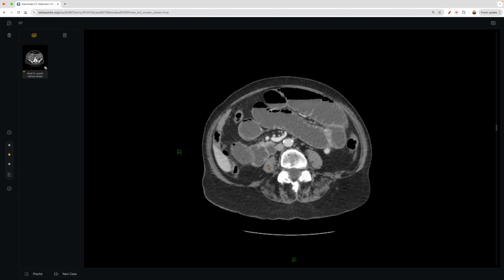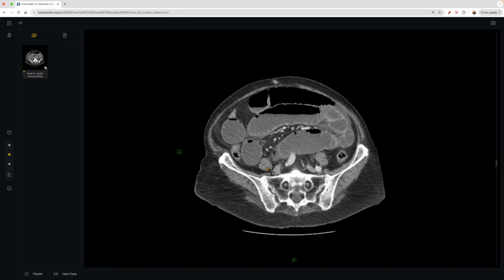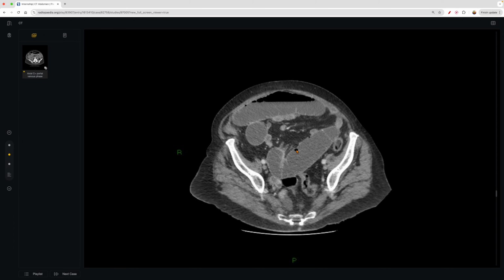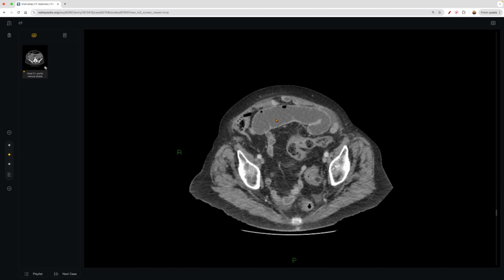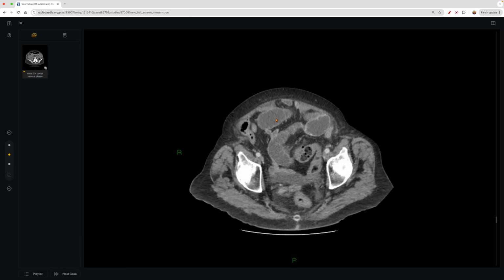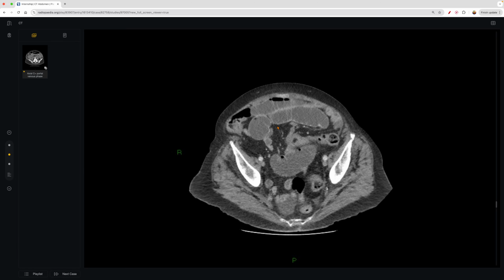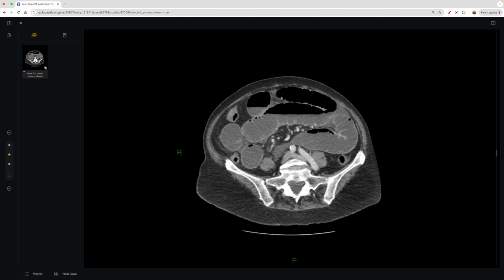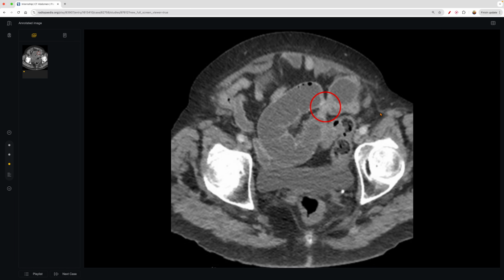We can see here, keep seeing it, and then the bowels themselves look a little bit more thickened. And again, it looks like there's a lot. If you compare it to the normal anatomy, we saw that the intestines were definitely there and occupying space, but they were a bit more subtle in their appearance. In this patient, we can go to the next slide and see that there's actually the transition point. For radiology, you certainly will want to identify that if you can. And for a medical student, just know that this is the pathology of a small bowel obstruction.